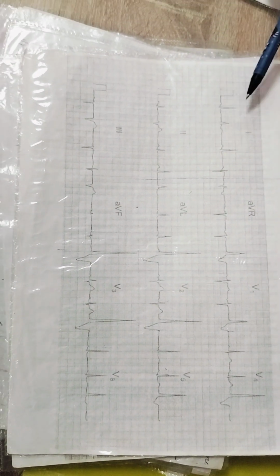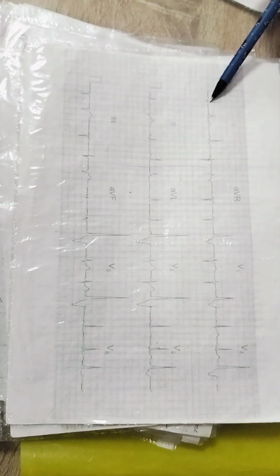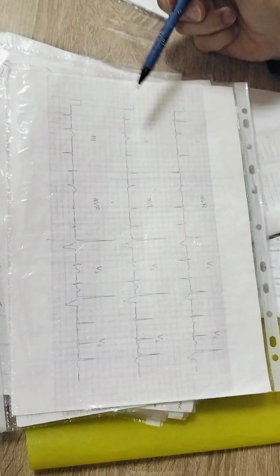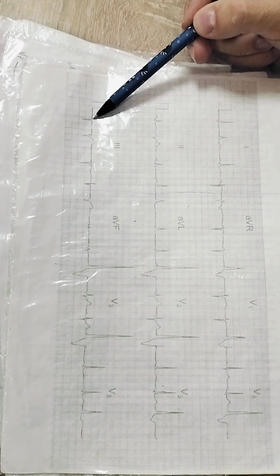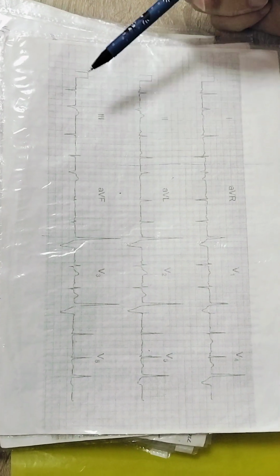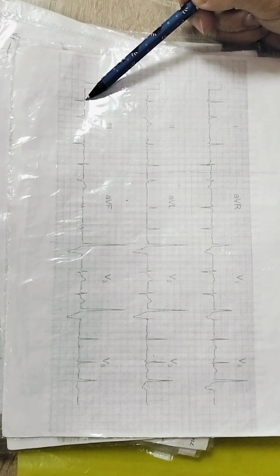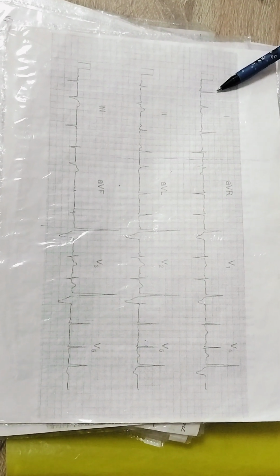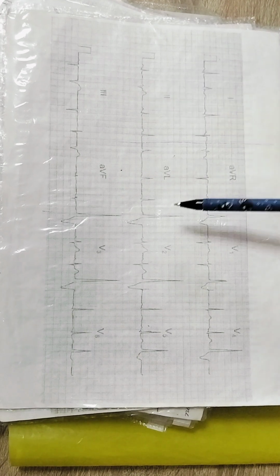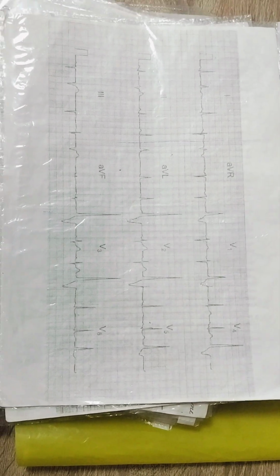Next is electrical axis of the heart. This one is 10, 12 millimeters. This one is about 5. This one is about 1 millimeter. We measure only positive part. We don't measure negative one. This one is S wave. It's not R wave. R wave is 1 millimeter wave. So there is shift of the electrical axis of the heart to the left. These complexes are abnormal. They look different from another one. It is an extrasystole. It is topic of our third lesson.